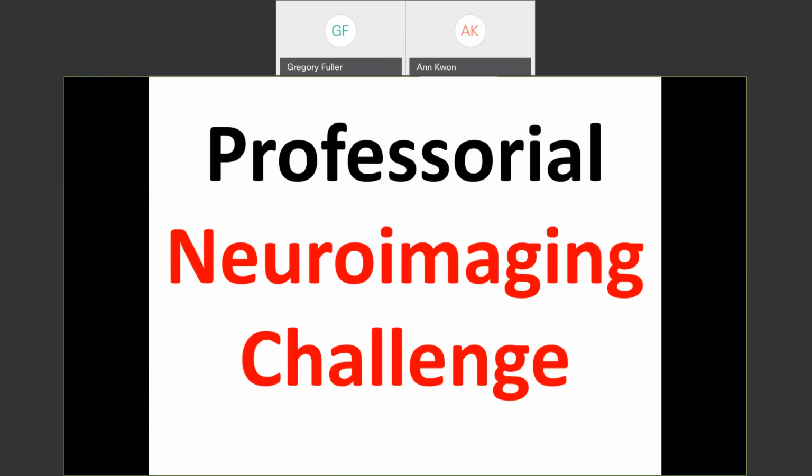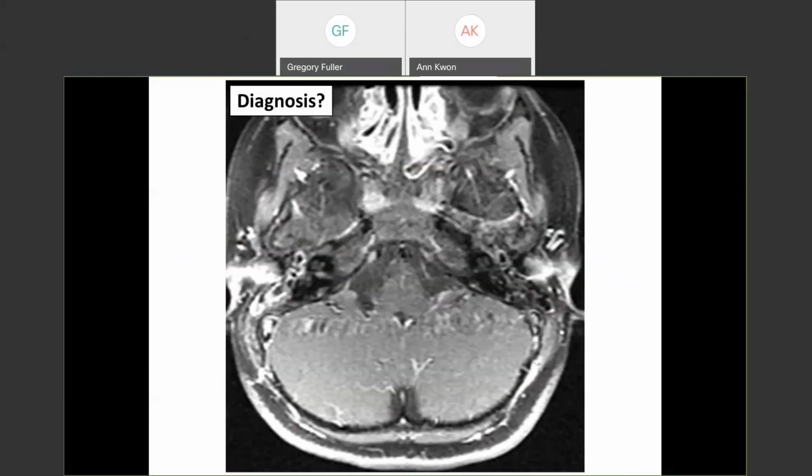All right, ready? Here we go. Diagnosis. Okay, I'm going to go ahead and give you 45 minutes to examine the slide. Just kidding, not 45 minutes. Anybody want to chat in, want to text in with a diagnosis? See, this is why it's professorial. If it was some giant meningioma or pituitary adenoma, then it would be easy. All right, let you study it.